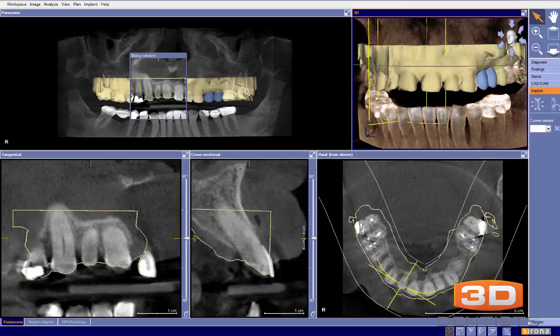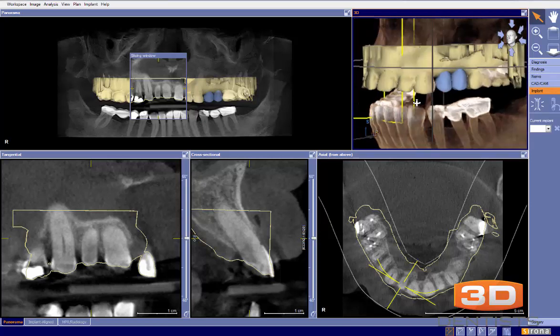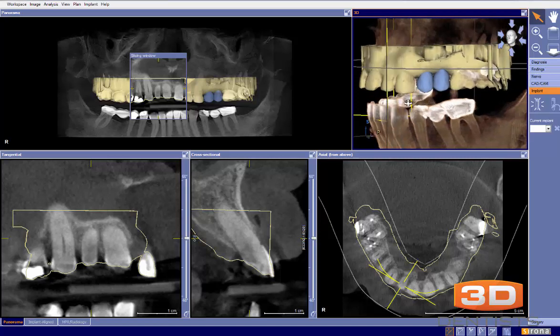Okay, we've been sent a case in today to evaluate. The notes are, would you take a look at this file and offer any critique in digital implant placement for number 12 and number 13. Unfortunately, there are no already planned implants there, so it would be difficult for me in this particular situation to offer any suggestions on any adjustments to the plan.